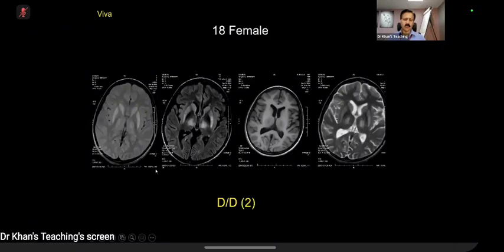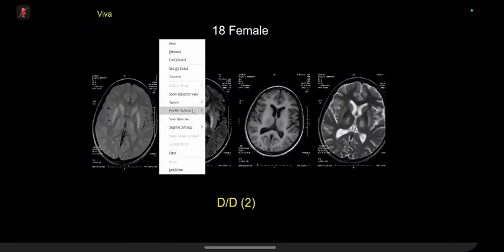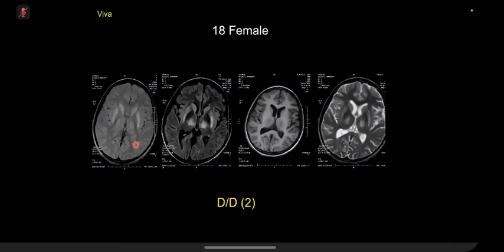Yeah, SWI? What? Yeah, is it T2 style? So this is a PD weighted sequence.